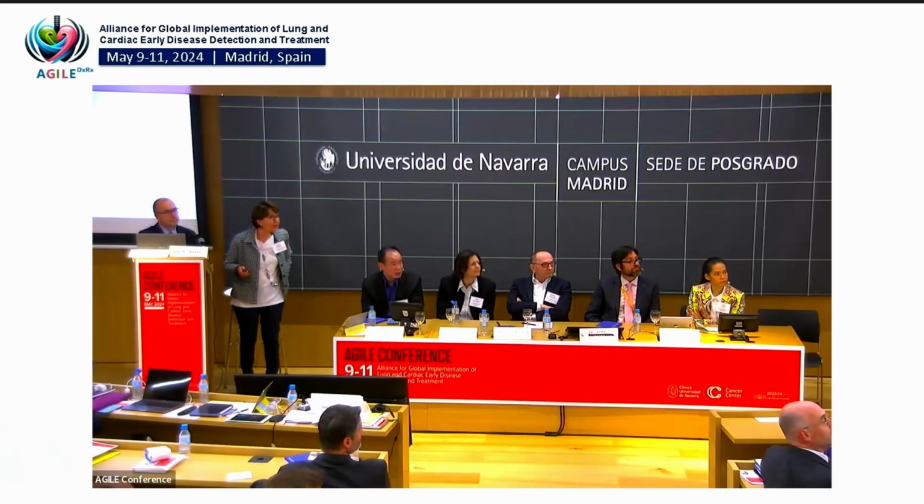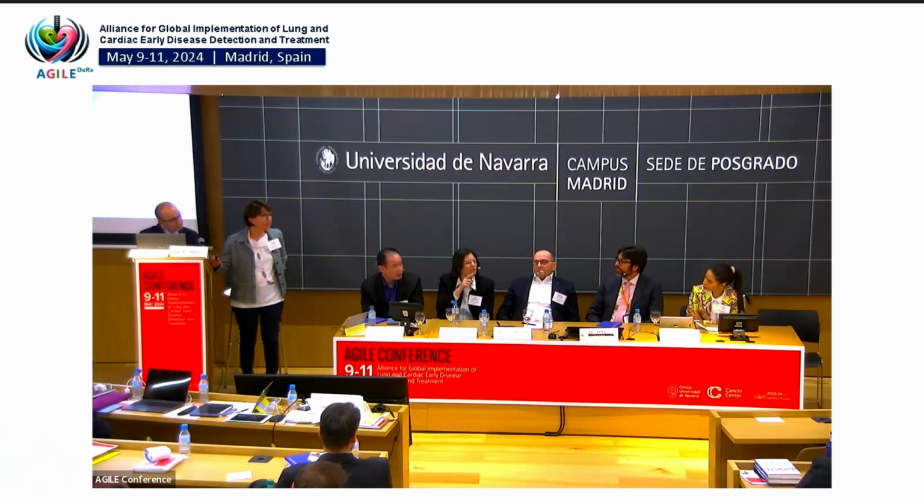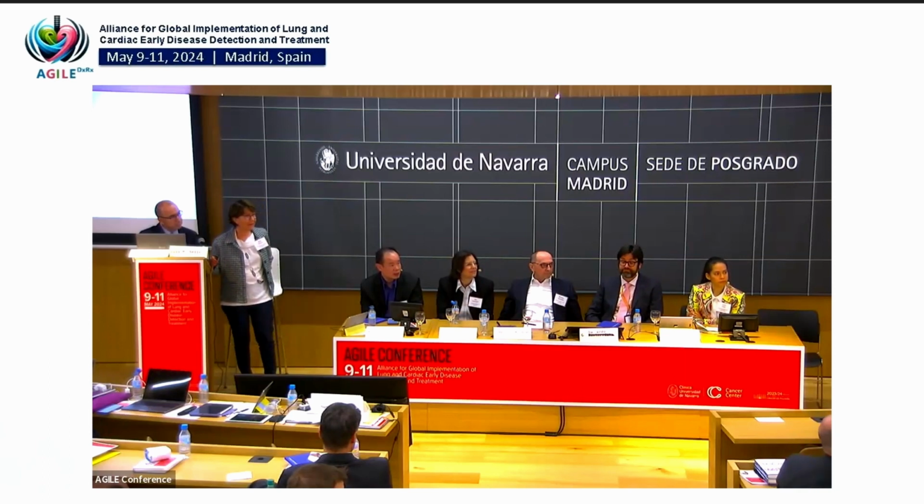What is the role of PET-CT in such a nodule at that time? This is the question of when to use PET-CT, and how sure we can be that this is an accurate study. When we have a nodule that is increasing in size, and we don't want to intervene by biopsy, which is risky because it's small in size, and we don't want to take it to surgery right away, PET-CT could have a role in such a situation, or not? But the nodule is already growing, so it's demonstrating active behavior. Does the PET-CT add anything to that? If the SUV is too high for its size, it's very alerting. So now we take it right away to surgery for biopsy. Or if we find a subtle active lymph node, for example, something else.